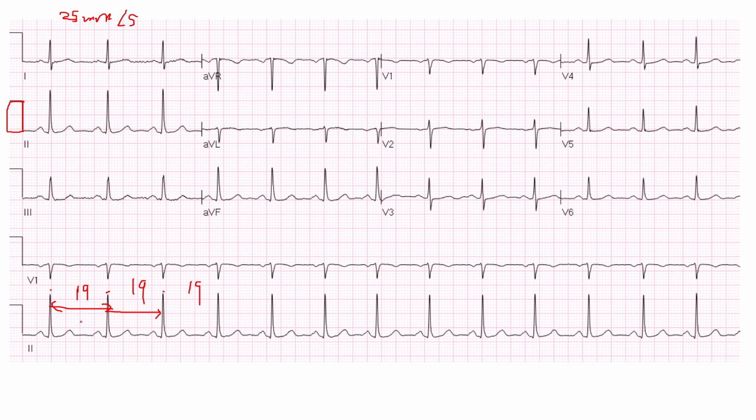The next thing is to look for P waves. That's followed by QRS complex. P wave, QRS, P wave, QRS, P wave, QRS. Now let's even go to another lead. P wave QRS, P wave QRS. So that's almost all P wave QRS. So we can say P waves present. So we have regular rhythm, P wave present. We can say we have a normal sinus rhythm. Already we can decide on that rhythm. And normal sinus rhythm, by the way, it means the conduction system starts from the SA node and it's normal. That's what it means, normal sinus rhythm.